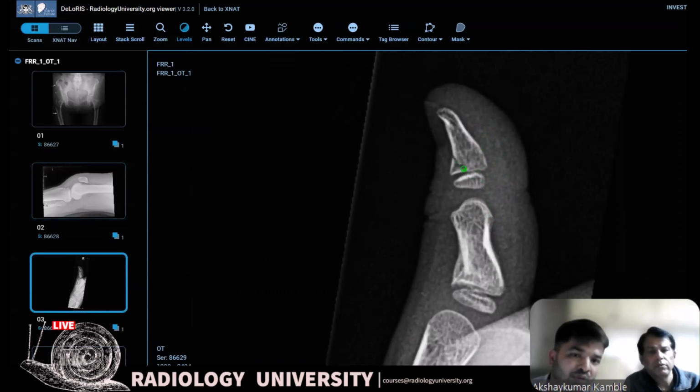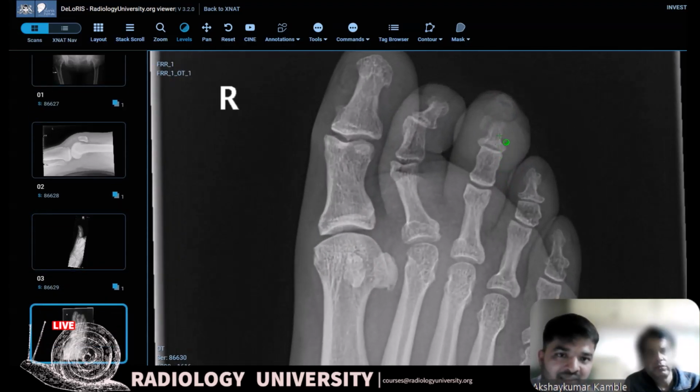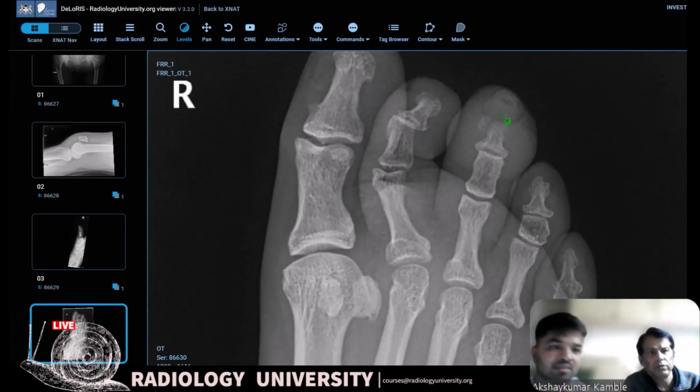If someone wants to shout out the answer, that's also fine. The distal phalanx had a fracture, and that was an old fracture. So I was telling them that usually they won't get any case like that with the two abnormalities. Yeah. So I think someone described this well as osteomyelitis as a differential. That was really good. Some of them have written fracture as well. I think they will.